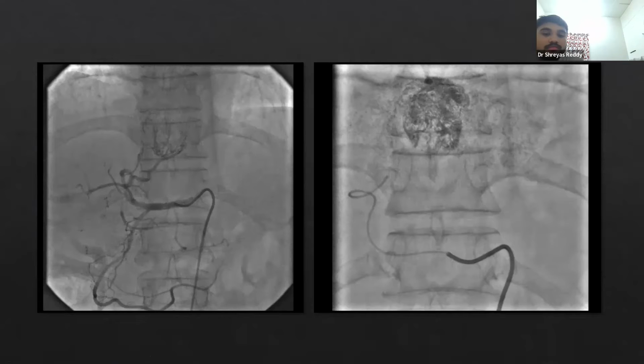So can you compare these two images? What is happening in the second image? Can you identify the catheters that are used over here? Can you name those catheters? Here we have used a microcatheter to extend deeper into the arterial system. Excellent. Yes, so that you do not infuse the whole drug into the entire unit, and you focus the drug exactly on that point of interest.